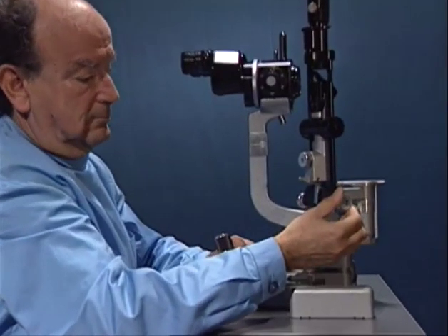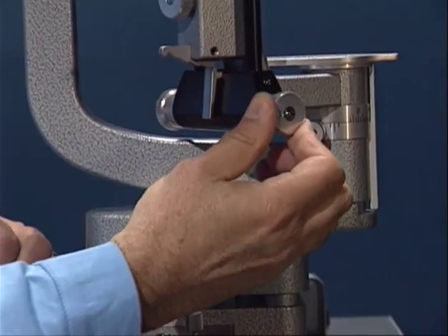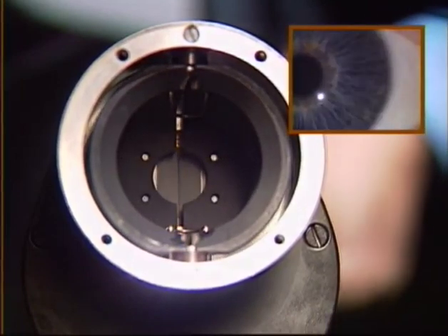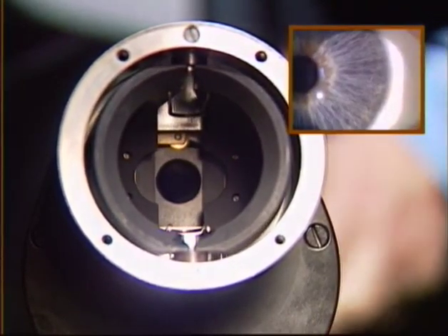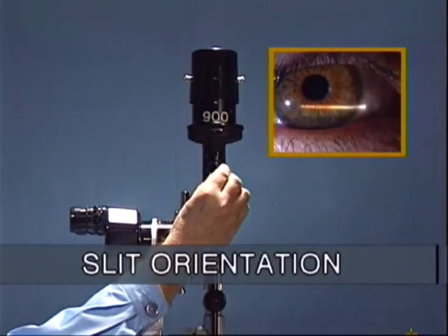This is the control knob for adjusting the width of the slit beam. A bird's eye view with the top of the slit lamp removed shows that the slit is narrowed and widened by a diaphragm with 2 moving jaws. This is the lever for changing the orientation of the slit. The angle can be read at this scale.